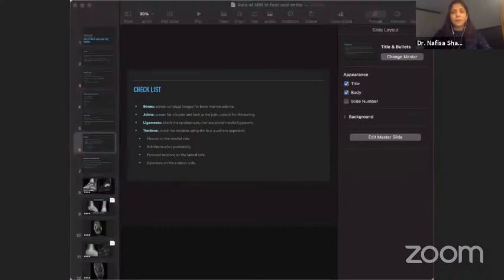I can share my screen here. This is how I like to look at the first three sagittal images. One will be a T1, in which case fat is bright, it's not suppressed. The other one will be a suppressed image where the fat is dark. The cortical outlines are always dark. In the T1, the fluid will be dark, whereas in any kind of T2-weighted or STIR-weighted image, even if you suppress the fat, the water becomes bright, and that is why you look at these images to look at hot spots. Anytime you have edema or fluid, you can start to look in that region for pathology.